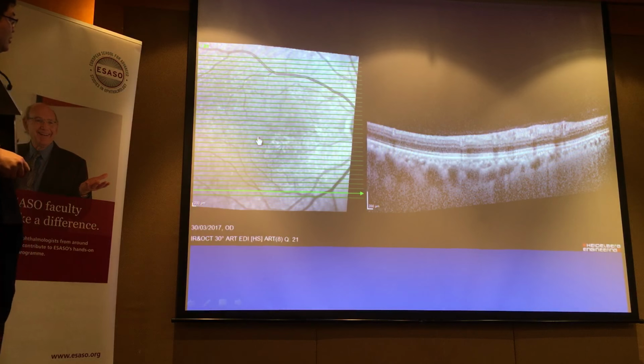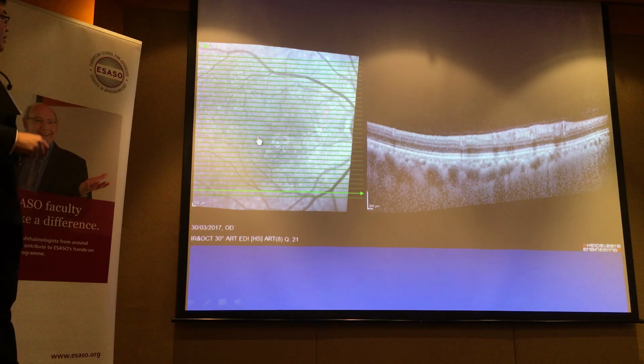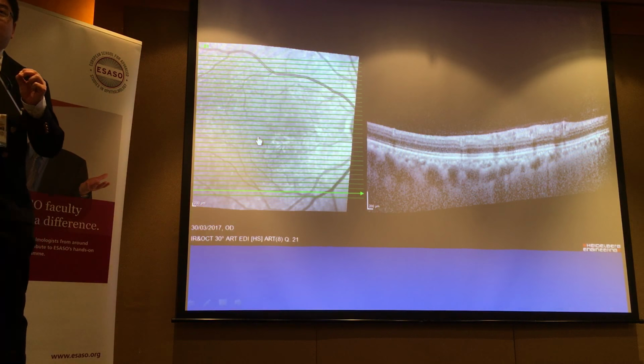Okay, so one other point I'll make before we move on is I talked about small lesions. As you know, some OCT machines have follow-on capabilities. It's useful because if you want to follow up the region, you can have point-to-point registration. It's very good, but there are limitations, especially for small lesions.